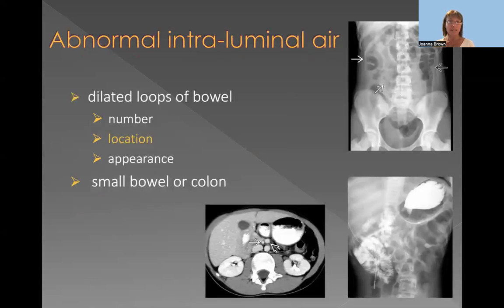And this is when additional examination was done on this child. We gave the oral contrast, and you can see here a small bowel study. And again, all of the loops of the jejunum are positioned on the right side of the abdomen.